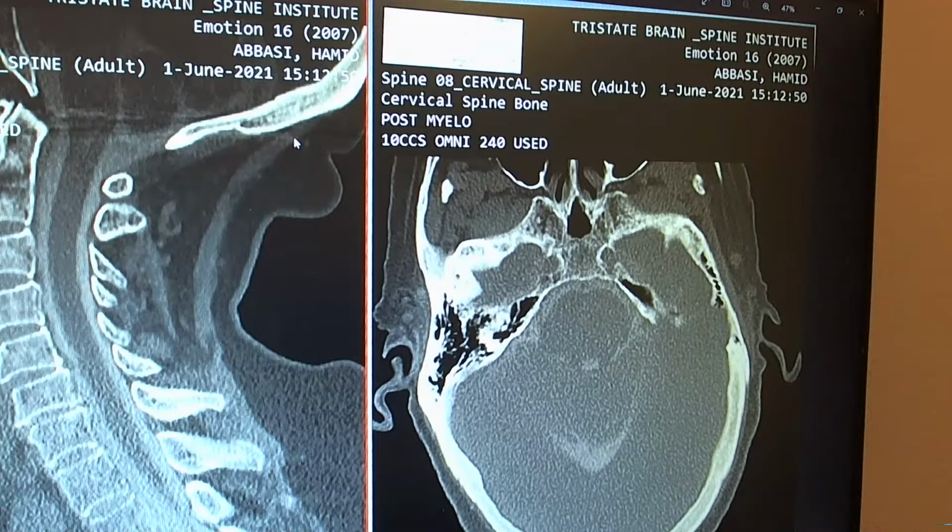I know you guys know it. It is a little different cut. This is the back, this is the front. Maybe that's what is confusing you. This is not the front. This is the front. No worries. Sometimes I make lots of mistakes even after so many years.